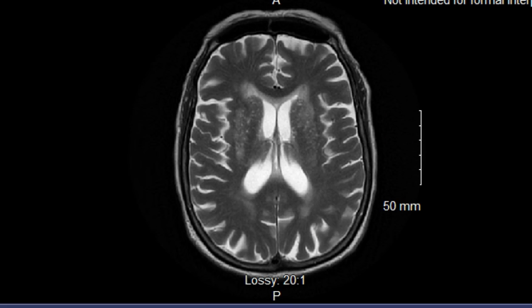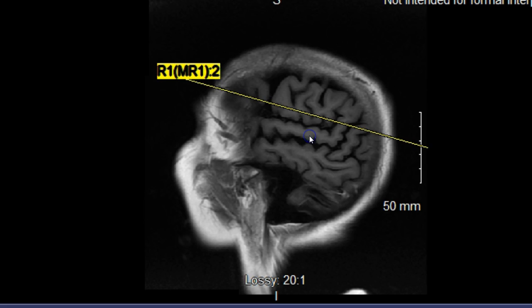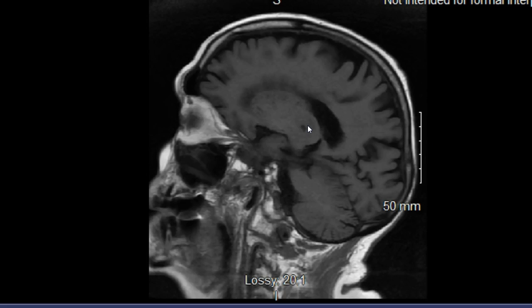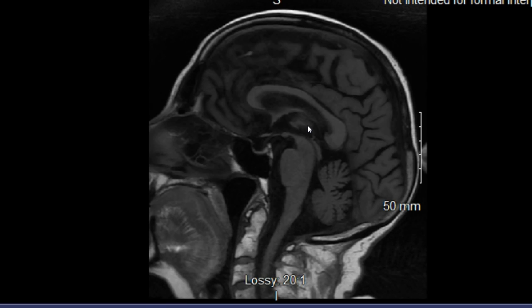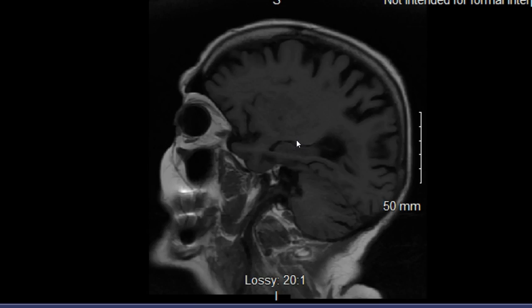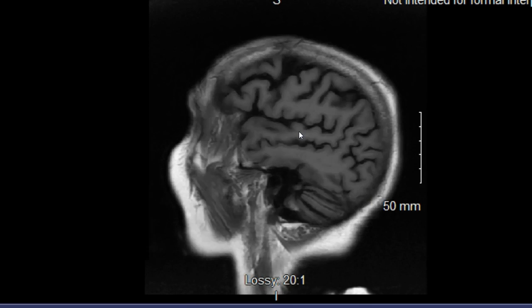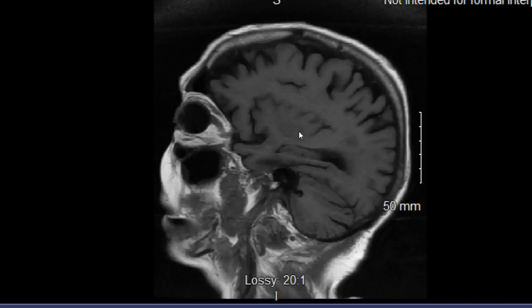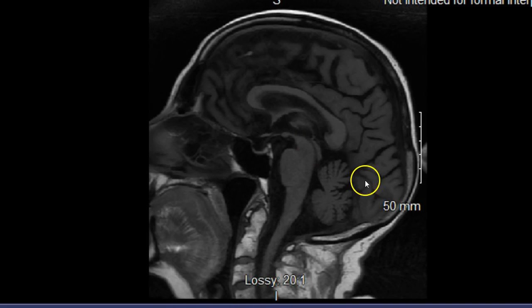And subsequently, speaking of orientations, we have the ability on this to look at it in sagittal orientation as well. So just to go through the body in sagittal orientation, you can see just in general how that looks from one side of the patient through the other side of the patient. And subsequently, once we hit mid-sagittal, that really reinforces some of those concepts that we talked about before.